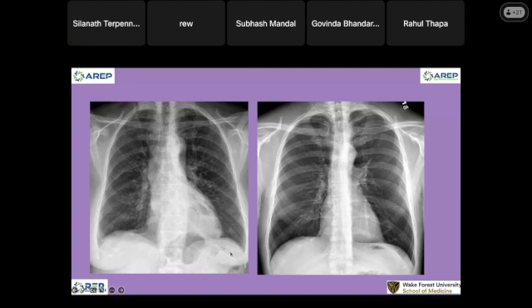So now we are toning down to the mediastinum and the heart. Okay, again, this is the structure that is pushing. Is there anything wrong here? Compare the heart on the left and the heart on the right. What structure is that? Esophagus? Cardiomegaly. Okay, the heart on the left looks a little bit bigger. The heart on the right looks normal. This one is the esophagus. What else? Thyroid tumor, I guess.